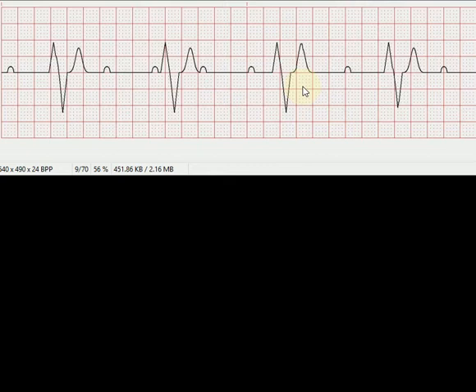It's an inconsistent PR interval and a regular R to R. The R to R is the same distance each time. So that is the hallmark of a third degree complete heart block. These are some of the most complicated rhythms that we deal with in this class. You do have a heavy number of these to deal with on test 3.